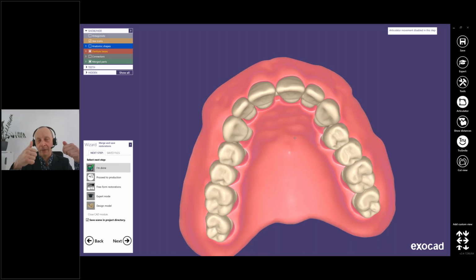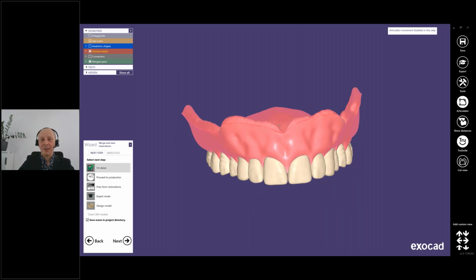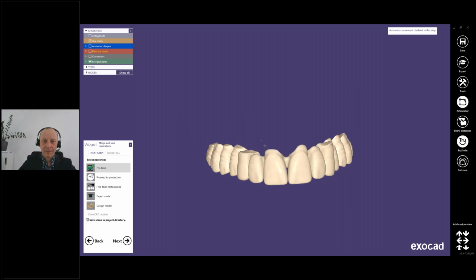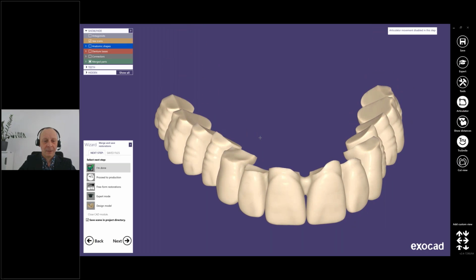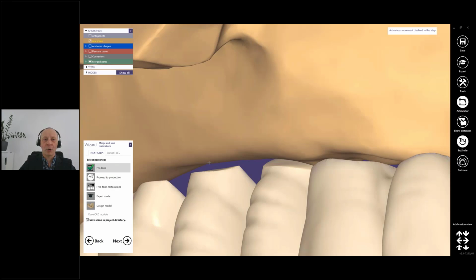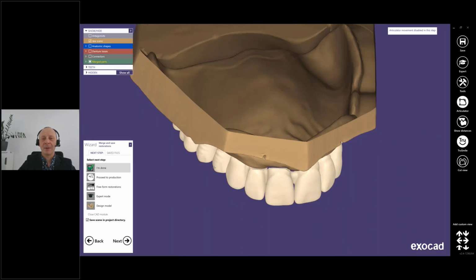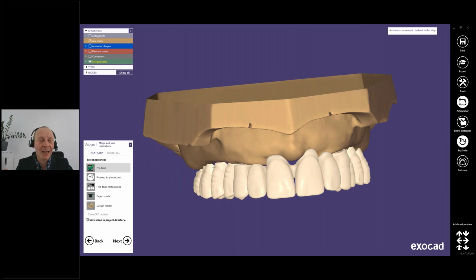Then you glue your acrylic teeth in the base and clamp this base with glued teeth in the milling machine and mill again from the basal side, both. This is what is meant by trimming the teeth. But in my case, the model teeth are trimmed as well with some gap between the model to ensure 0.3 minimal thickness for my base. But this is not the same as trimming by a milling machine.